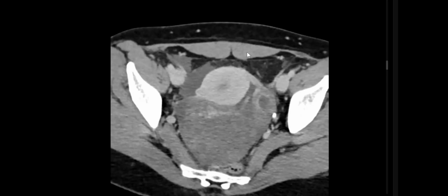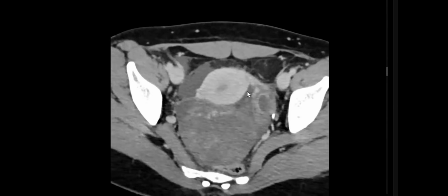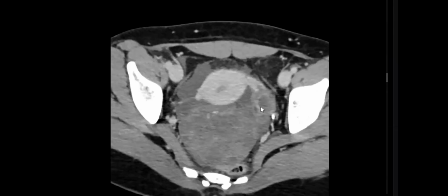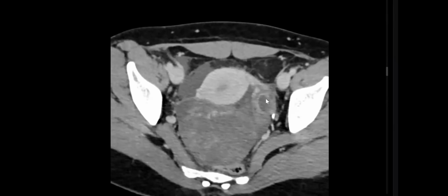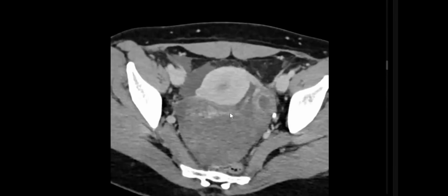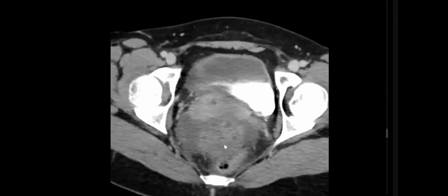So we are in the first category, severe pain. Here, this is a broad ligament, and this is a relatively normal left ovary with some follicles and this small cystic structure, maybe dominant follicle, it may be corpus luteum. So this is normal. But this structure, I don't know what is this.